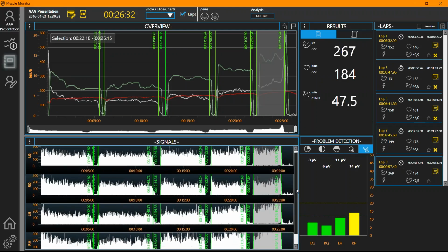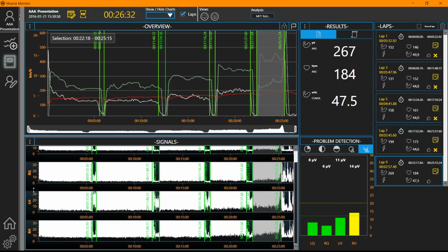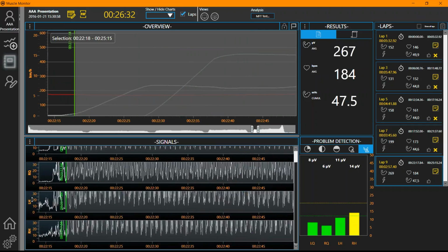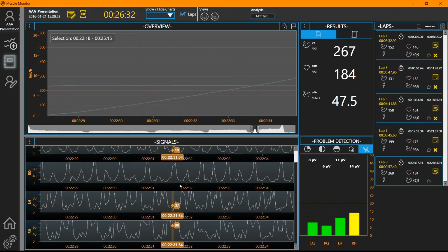And how you can actually see it in data roughly: if you see the values very low, you can even zoom in if you wish. Well, actually, I can take the scale a bit back. So this is what happens in the very short time span.